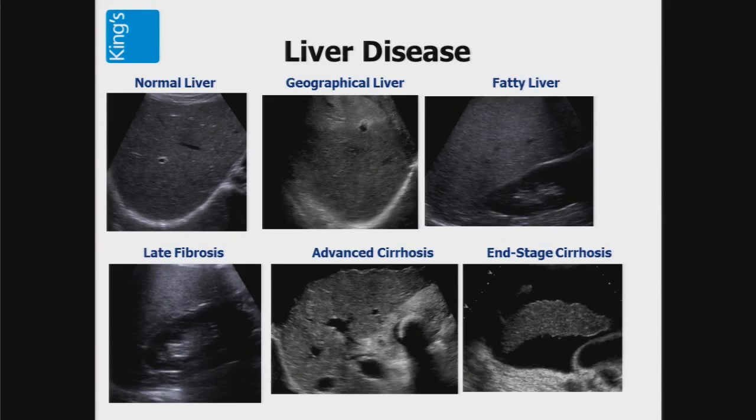We're all used to looking at the liver, and by sticking your thumb up in the air and guessing, you can say, well, yes, this is a normal liver.